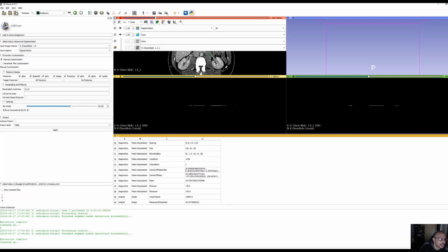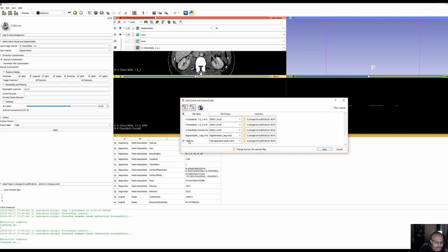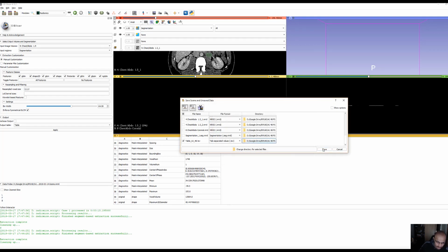So you want to save this table, okay? And now you can see here, right? And I'm not going to save that. Right, so AJ48, okay, let's call it that. AJ48. Okay, it's going to go back into the same drive. You can change where you want to save it by clicking it, and you can select a different directory, right? So yeah, maybe we should do that.